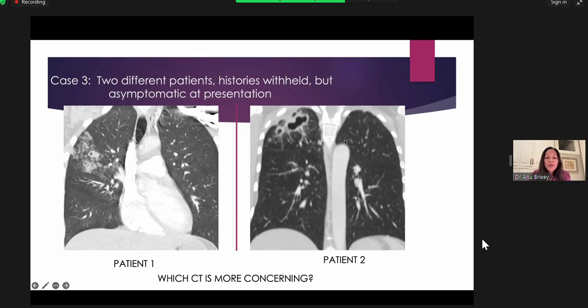Well, if we look at patient 2, we definitely see this large cavitary lesion in the right upper lobe. There's also an adjacent cavitary lesion. There are a couple nodules that are present, but it's very well demarcated here. And clearly you can see that, well, I shouldn't say clearly, but this patient did have some degree of volume loss here. When we look at patient 1, we also see that these abnormalities are predominantly in the right upper lobe. You can see that minor fissure.